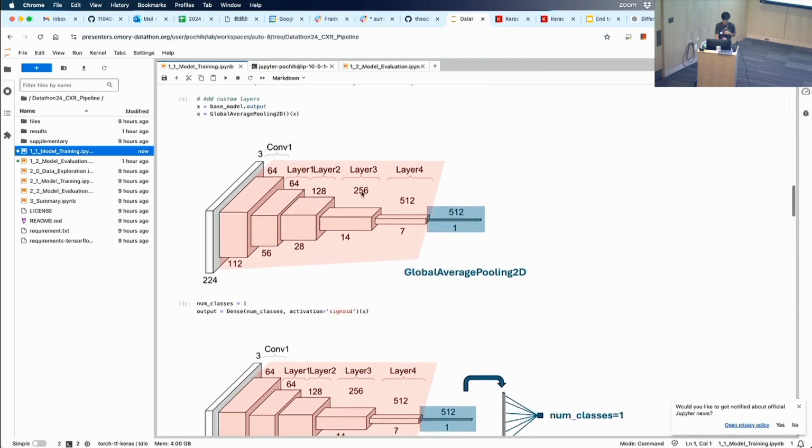You have 2 options here, but you're using one: adding your custom layers at the end so that you move from cats and dogs to pneumothorax, non-pneumothorax by using this global average pooling 2D. If the instructor is not explaining it or you want to learn more, I would put that in ChatGPT and say, explain this to me. Yes, that's right.